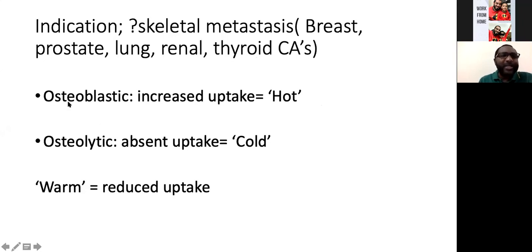So what we're looking at is osteoblastic activity. Any area that shows increased osteoblastic activity will show as increased uptake, and this is the term used as a hot spot. Each time we refer to a hot spot on a bone scan, it means that area has increased osteoblastic activity. The area can be dark depending on the color preference you use, but oftentimes bone scans are displayed in black and white, so it will be a black dot.